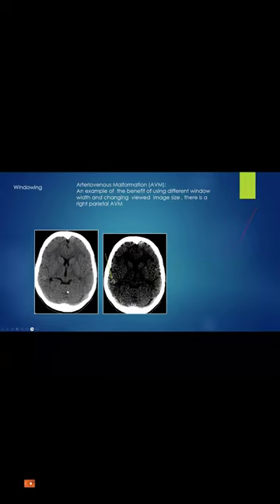Here, this patient has headache and there is a little hyperdensity here. That was not hemorrhage, it was AVM. But AVM and hemorrhage, look for subtle hyperdensities. Sometimes you'll be able to see a vascular structure that is not in the expected location, which might raise the concern of arteriovenous shunting.